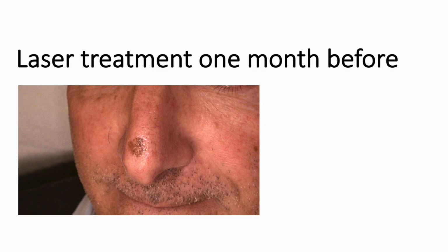But we're not just called to perform a diagnosis before the treatment. Sometimes we also need to perform differential diagnosis in patients that underwent treatment somewhere else, in other centers, like in this 60-year-old man, who underwent two treatment sessions with laser of these pigmented macules on the face.